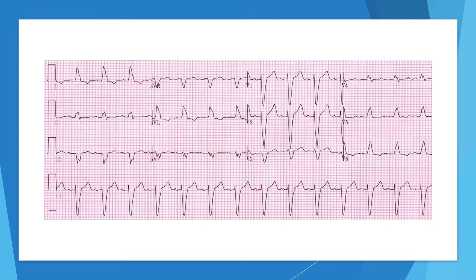Okay, another example, a downward QRS complex in V1 that is wide, upright in V6. There is an upslurring, but not the classic M pattern that you might see. But again, this is a left bundle branch block.